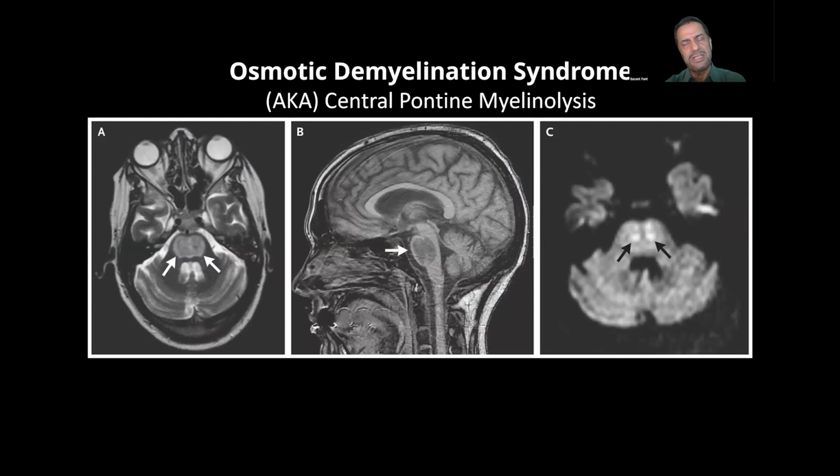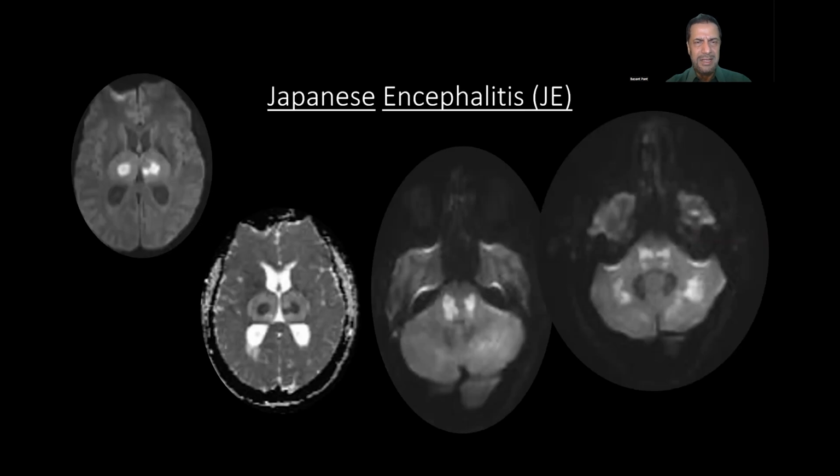But you can also see this in uremic patients and in people on long-term hemodialysis. A very symmetrical type of encephalitis, inflammation of the brain on both sides, maybe due to some involvement of the perforators. This kind of image you see in Japanese encephalitis.